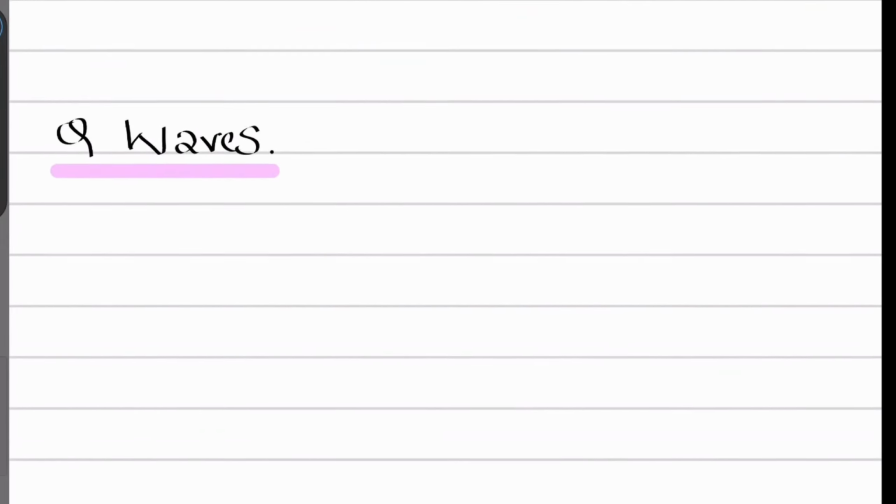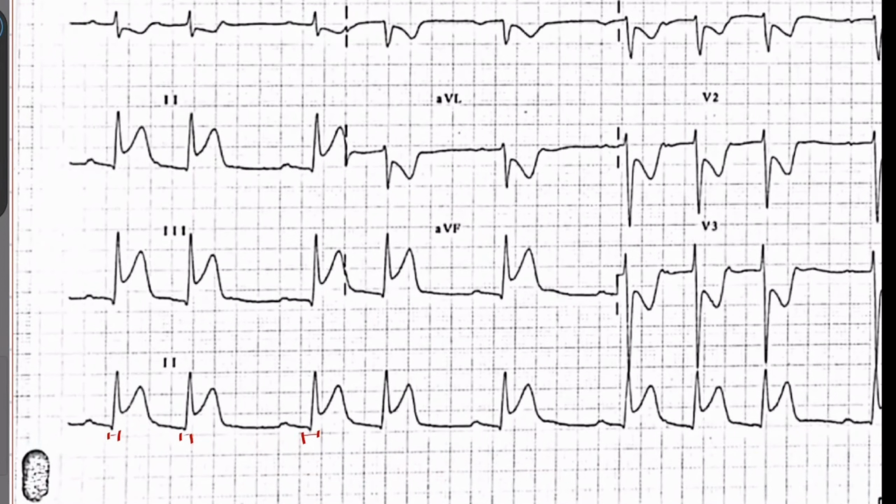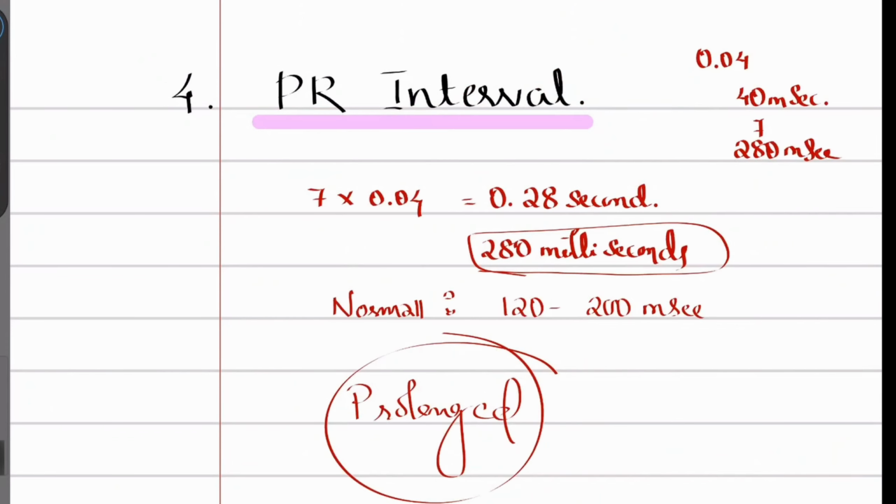That's it. Now you check the Q wave. When you're looking for the Q wave, you should check all the leads. Is there any Q wave here and there? So you see a small Q wave here. You see a small Q wave here. In some leads you also see some small waves. But you understand that these Q waves are not at all pathological, like it's not more than 2 or 3 small squares, so it's insignificant, so just leave it. Then we can directly tell that there are no pathological Q waves.